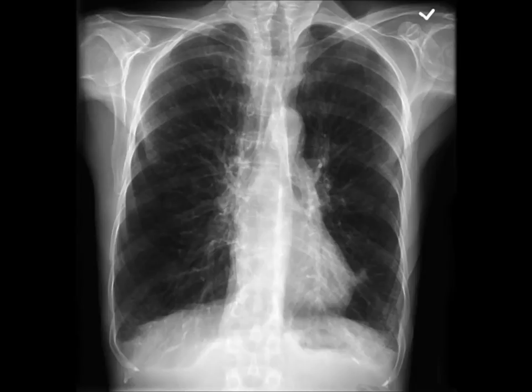First thing to comment on here is the technical quality. The patient may be rotated slightly, although it's difficult to tell, and it's hard to see the intervertebral spaces through the heart, suggesting underpenetration. The most striking thing to note is that the lungs are overinflated, with the 8th anterior rib intersecting the diaphragm at the mid-clavicular line. Going through our system shows that there are flattened hemidiaphragms on both sides, with blunted costophrenic angles. And you can also see some small areas of increased opacity in the hilar.